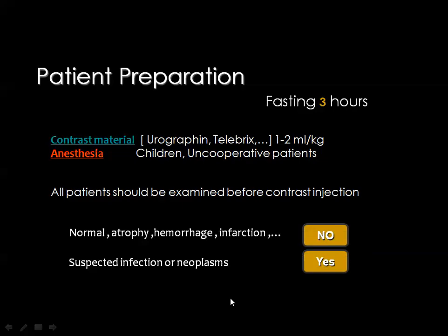As you all know, we usually evaluate the brain by CT in cases of emergencies, and I have discussed the way how to assess the brain by CT scan in the lectures previously introduced about imaging of the normal adult brain and also imaging of the normal pediatric brain.